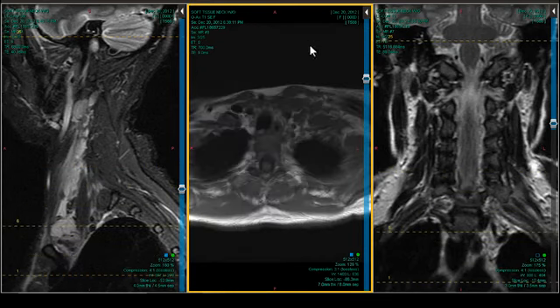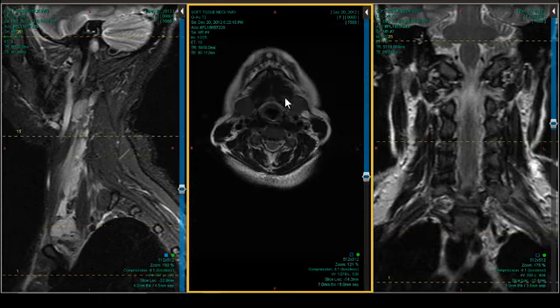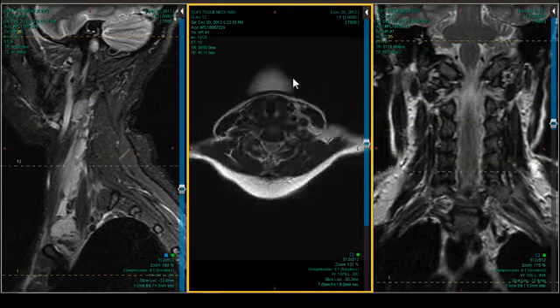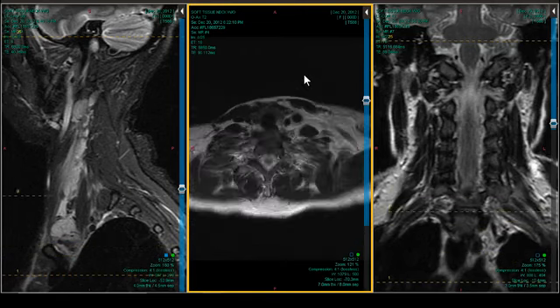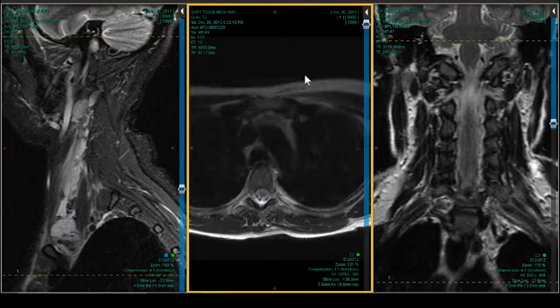All right, so now that you've had a chance to digest this case, because you should make this on your own, I'm going to put the T2 back up because I think it's the easiest one to make the findings. So we said left-sided swelling, so I'm going to be looking at a mass. Maybe there could be a potential incidental mass on the left side. If there isn't, then now you're giving the patient two diseases. That would be kind of silly.